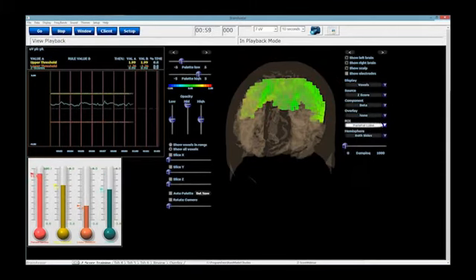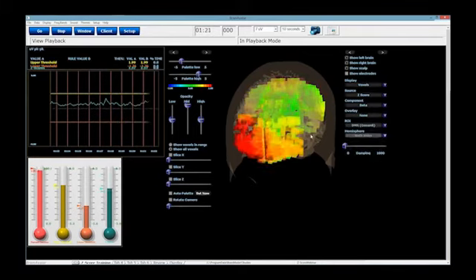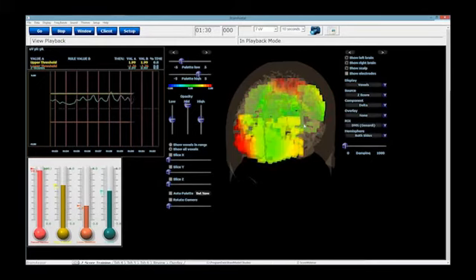So, what's nice about Select ROI and Select Band is that you don't have to remember, oh, I'm training this with this person today, so I'm going to have to go in and change it in all 4 of my events. You don't have to do it. You can go, all right, let's go. We're going to train this right here. The thing to be careful about is going through and just kind of clicking around and changing what you are training. That could be not as applicable or not too good depending on who you're working with.